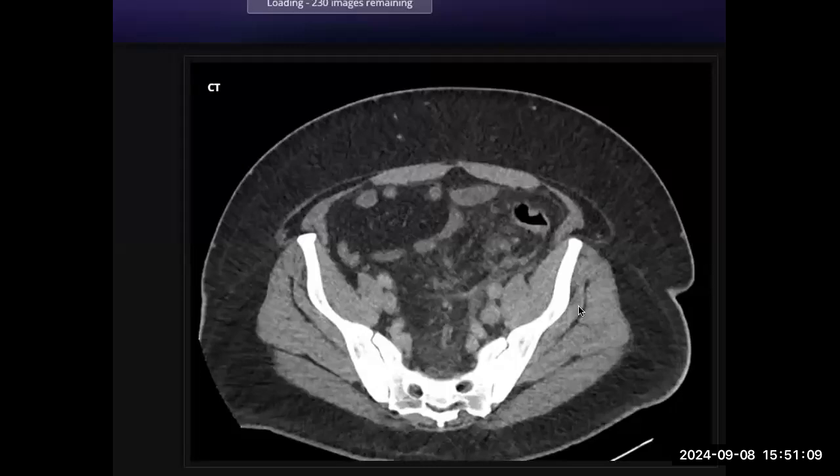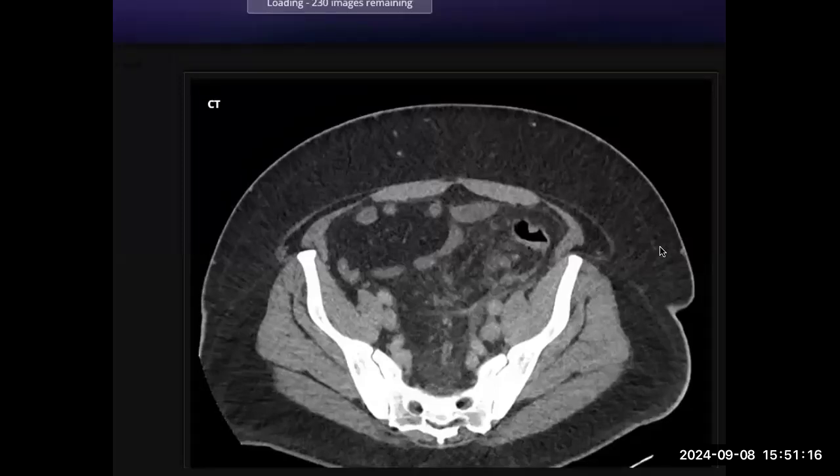No, it's not including the last one, it's loading. Let's go back to the upper part. What are you seeing there in the upper part where you were telling me about the nodes? Can you go up? I'm trying to go up. Can you leave the mouse once? I'll just try once.